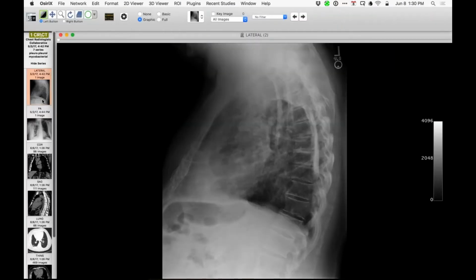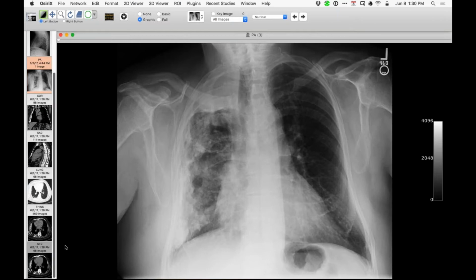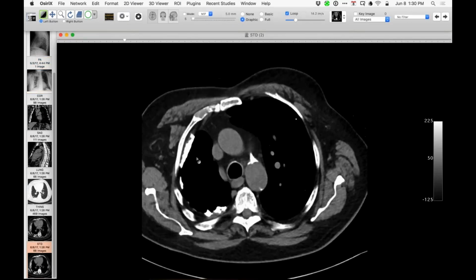Well, we've all kind of seen this before, but it's pretty dramatic. We don't see this very often, at least not in the US, right? So here's a patient with a chest radiograph that looks like that. We can easily diagnose a very extensive calcified fibrothorax, and with a history of TB, that fits very nicely. I want to ask you what you think about this. When I looked at that, everything just fit very nicely.